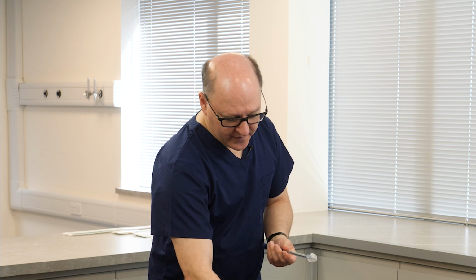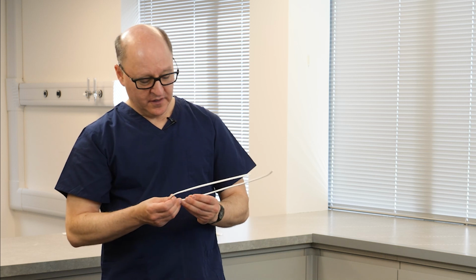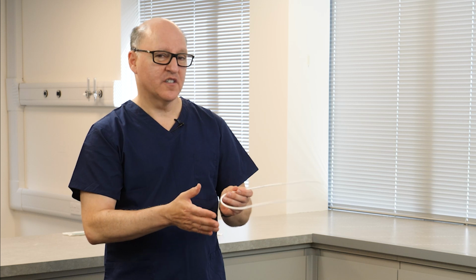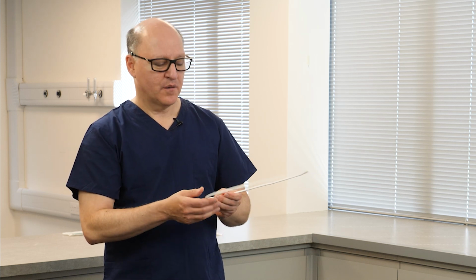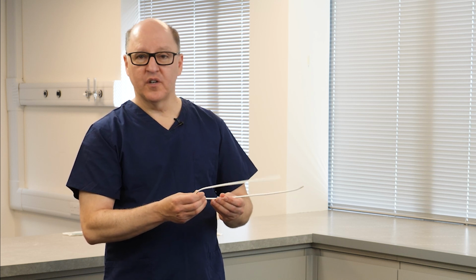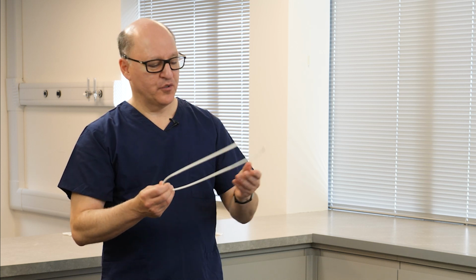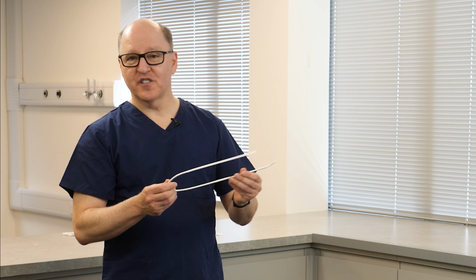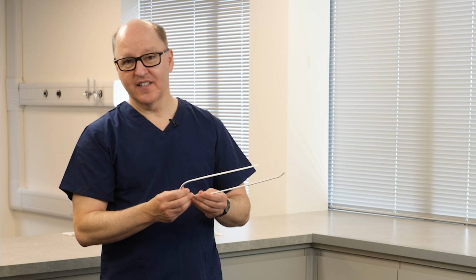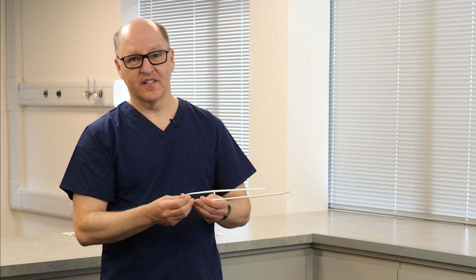About 10 years ago, I began developing a device that I believe achieves all 3 of the benefits of using these different devices with their respective blades, but does so actually more efficiently and gives you more reliable tracheal feedback. This product, the Universal Stylet Bougie, in my opinion, is a better stylet than a stylet. It's a better bougie than a bougie, and it's a better hyperangulated tube introducer device than the rigid, standard, hyperangulated stylet.